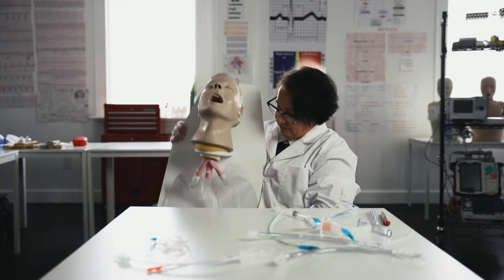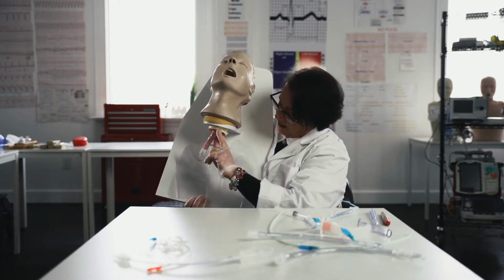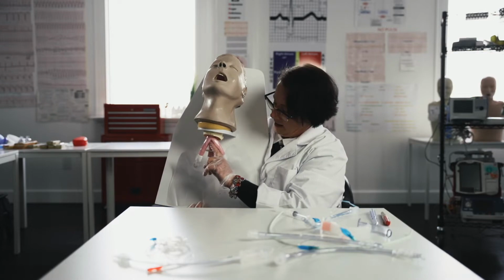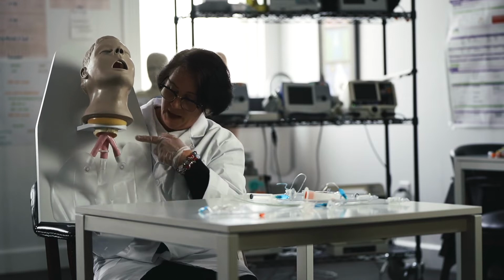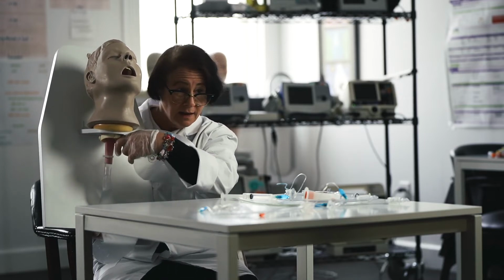So this is the inside of our body. That's our airway, our trachea in the front. And then it bifurcates. And this spot's called the carina, where it goes left and right. This is the left lobe of the lung, and this is the right. So in the front, it's our airway, breathing. Right behind it is all our digestion, our esophagus going to our stomach.